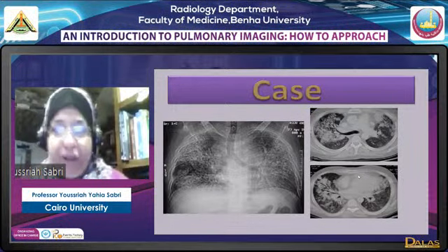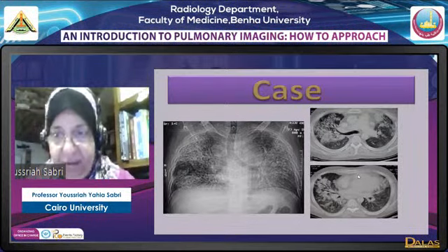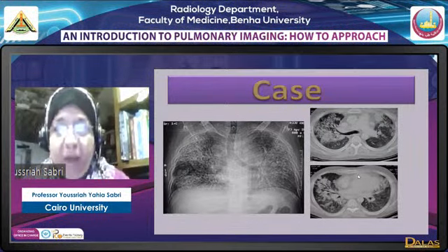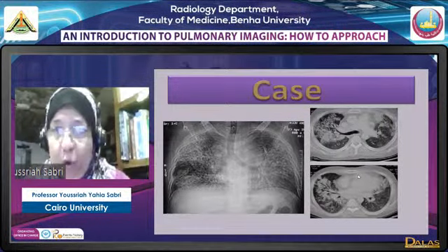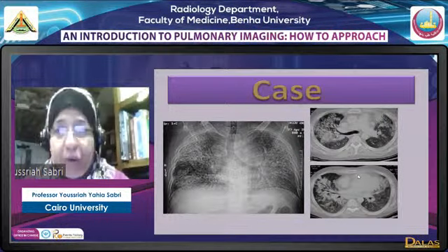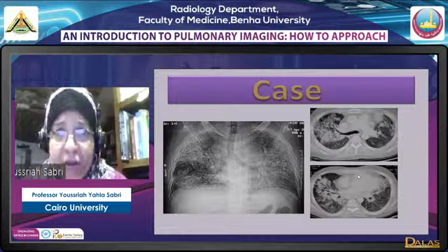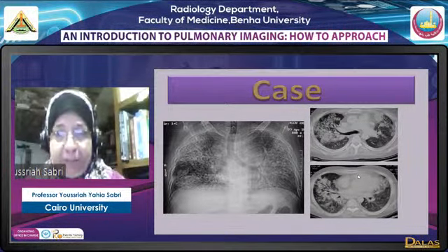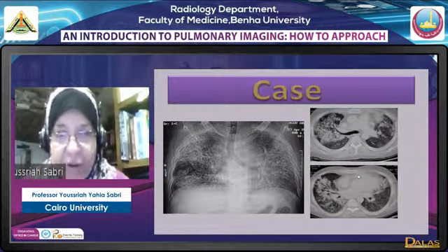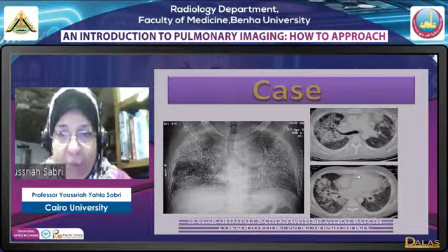So this patchy diffuse appearance that affects both lungs has a very wide differential diagnosis. Here we must be guided by history. The commonest cause actually is bronchopneumonia, but hemorrhage may have such an appearance, atypical patterns of edema, atypical pattern of eosinophilia. Some tumors may be presenting with this same pattern. It has a very wide differential diagnosis, okay? So the commonest is bronchopneumonia.